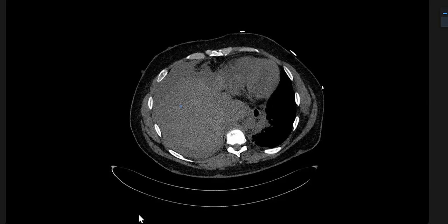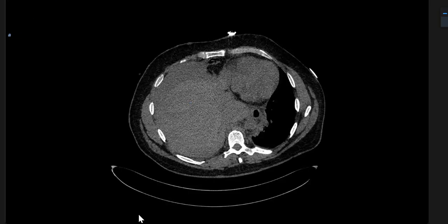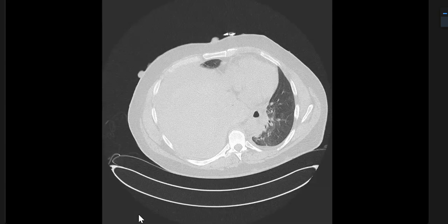So I will want to see the right lung. This could be a mass in the collapsed lung. The mediastinum is shifted toward the left side. I will also look at the lung window. The left lung appears relatively normal. However, the mediastinum is shifted toward the left side.